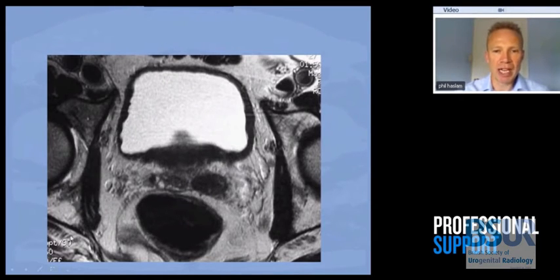Unfortunately for this patient, on a slightly higher axial slice, you can see the left seminal vesicle here is uniform low signal, and this has been invaded by tumour. Something to watch out for here, if you look on the right-hand side, this low signal structure here, this is actually the vas, and this is fairly fibrous tissue and looks quite low signal on the T2 weighted scan. Now, the other thing to note is you would always look at the T1 weighted scan on these patients and check that this isn't low signal due to hemorrhage. So if that was hemorrhage, it would look bright on a T1 weighted scan. In fact, in this patient, this is tumour into the left seminal vesicle, so this is T3B disease.